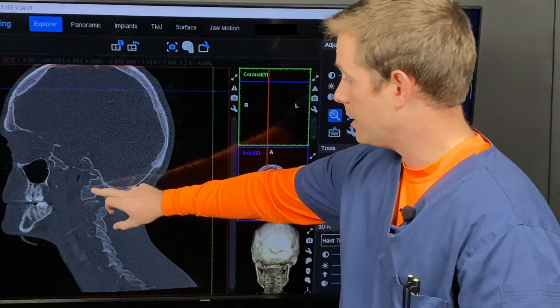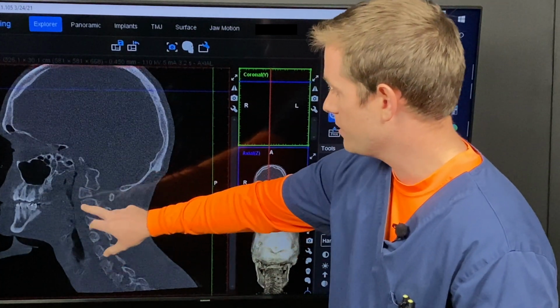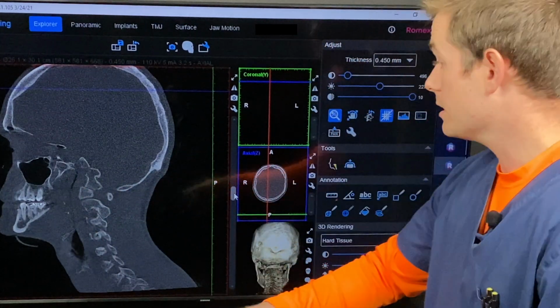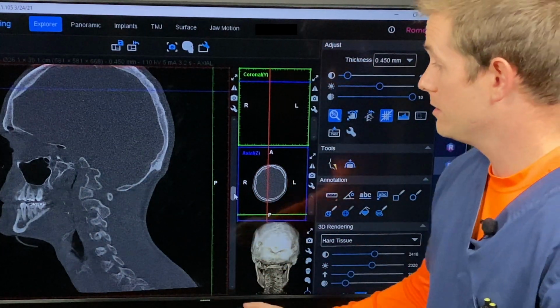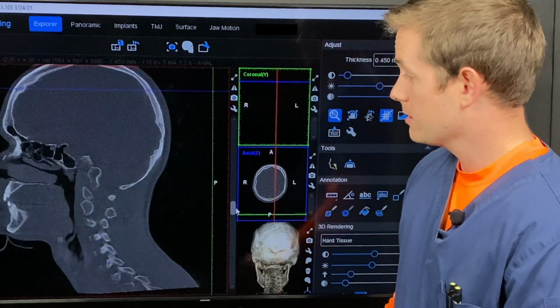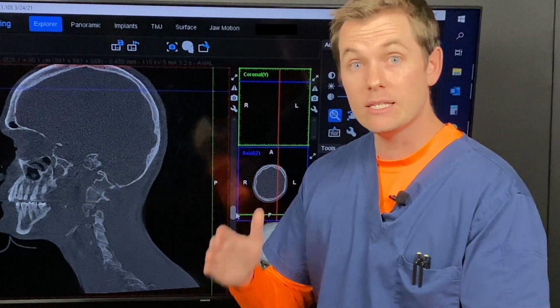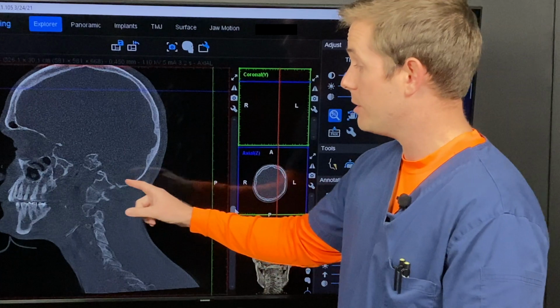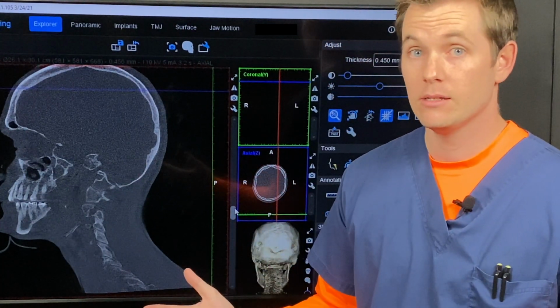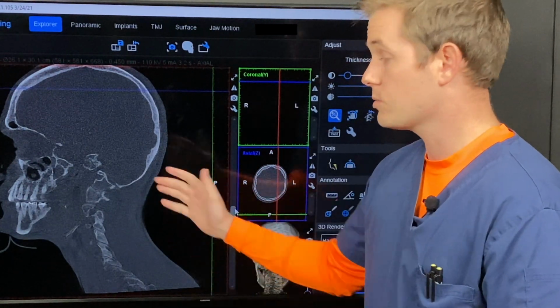And as you scroll down from right to left, we're going to see, you can freeze there, this joint is not lining up whatsoever. But let's look through on the other side. So as we keep scrolling down, keep going, right there. Do you see how this side is nice and flush? This is exactly how a C0, C1 joint should look, but when there's some ligament laxity, you might get some subluxation of the C0 at the C1 level, which we saw on that other side.